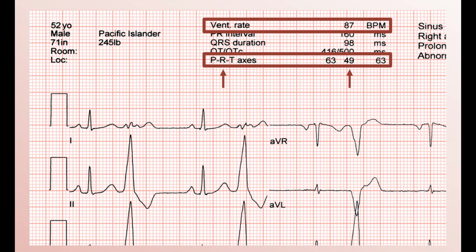The reason one should be able to determine the rate manually is twofold. Sometimes you'll need to figure out the rate on a device that is not a typical EKG machine, for example, a printout from a portable cardiac monitor that one might find in an ambulance. Second, although very uncommon, the EKG algorithm sometimes gets the rate wrong. This can occur when the QRS amplitude is very small or when the T waves are excessively prominent.